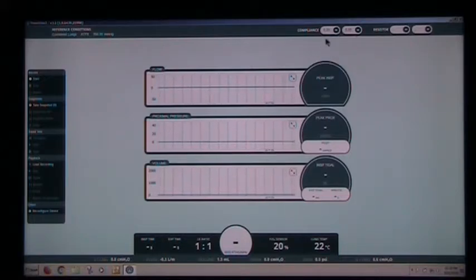And so there's a right and a left because the lungs can be set independently with different compliance. You also set your resistor values here for right and left lung. Now again, the resistor values do not affect our calculations, but they certainly affect how the lung is being ventilated, what your waveforms will look like, and what your values will appear to be.